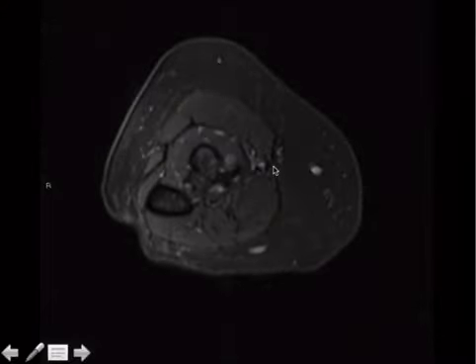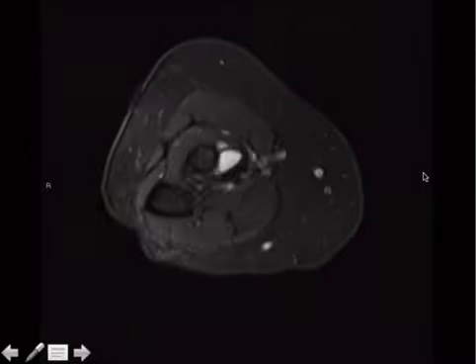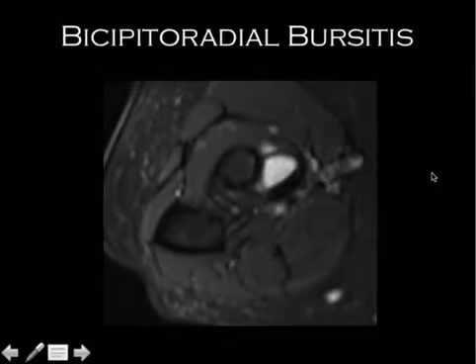So that is the biceps tendon. All right. Biceps comes down on the radius. So that is the bicipital radial bursa. That's that fluid thing. Biceps tendon attaching right here. Okay. Following it back. Following it down. Bursa there. Bicipital radial bursa. So it's where the biceps attaches on the radius. There's a bursa. Looks like that. That's all you need to know about it.